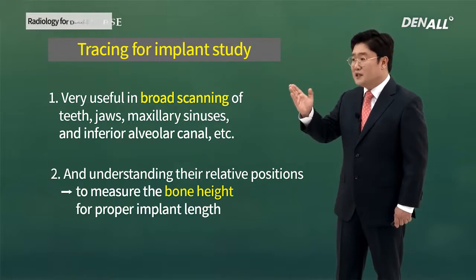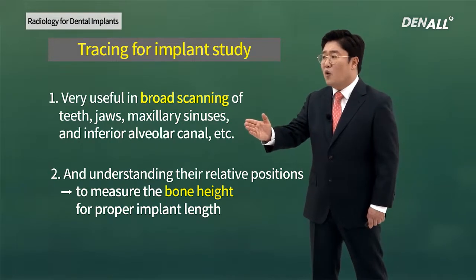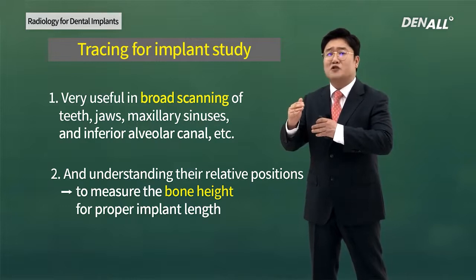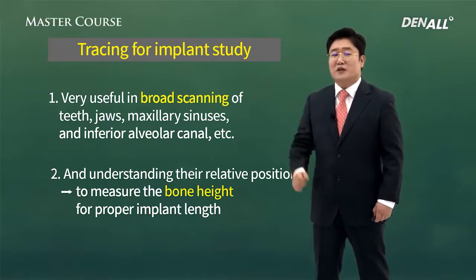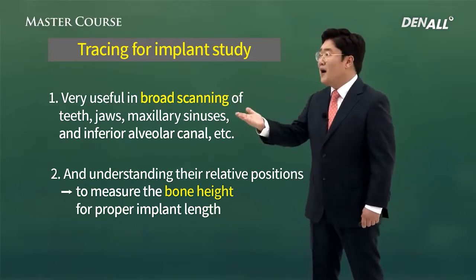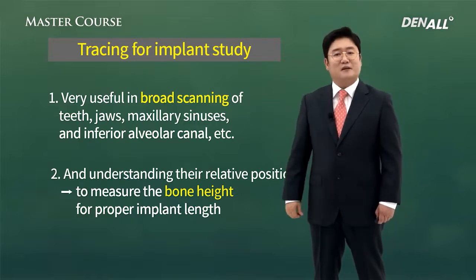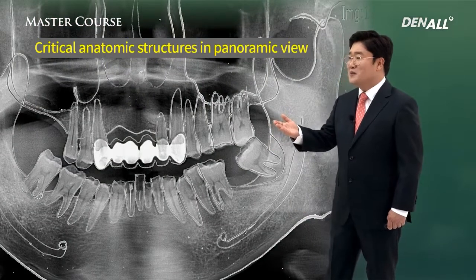And more importantly, through the panorama pictures, the bone height where implants would be placed later could be identified. That was the big purpose of using the tracing. Panorama X-ray or panorama radiology. Over that, tracing was done.